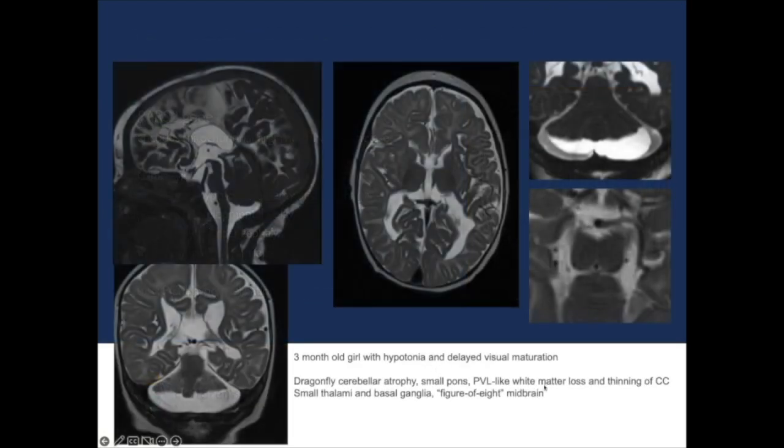This case you've seen in a prior talk, and this is one that I actually got wrong when the patient came around. This is one of Jane Anthony's patients. And she came and asked me, what is the gene? I said, oh, I'm not really sure there's a gene at all. It looks like they've got some white matter loss supratentorially. Looks sort of PVL-like. So the vermis looks normal, but then you've got this loss of the inferior parts of the cerebellum, and I couldn't really make a rhyme of it, but I just hadn't seen this before, right?